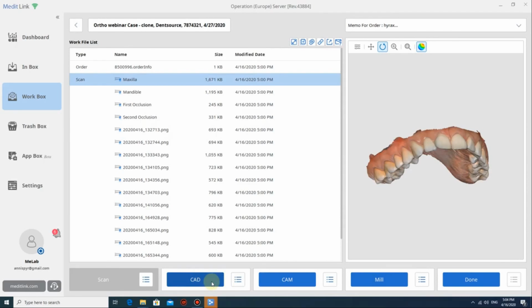So now it's the moment I leave the wheel, and my colleague Giuseppe from Maestro will take the lead and start demonstrating to us all the features and capabilities that you can do with Maestro. Giuseppe, I give you now the wheel.